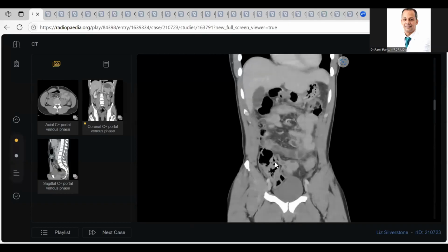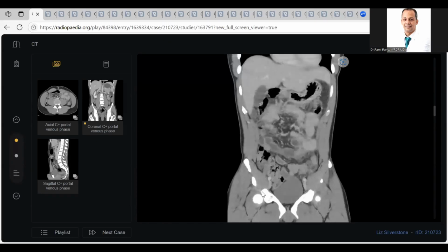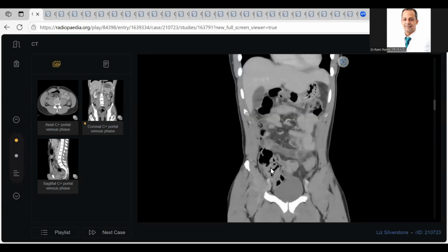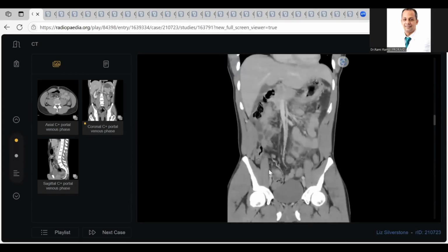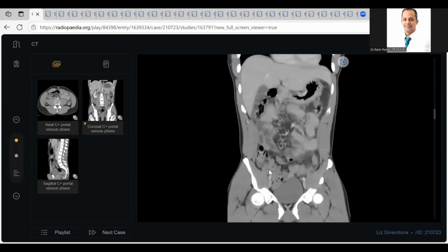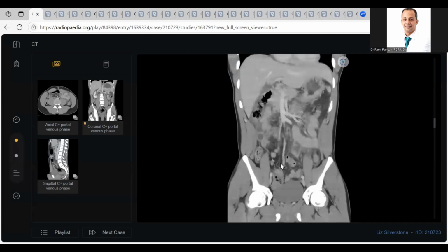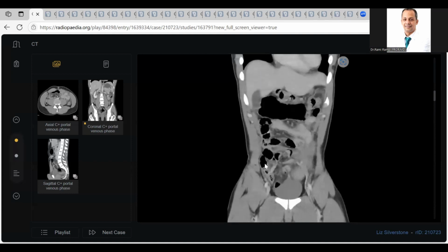Okay. Don't worry. What else do you want to exclude from the CT in case of appendicitis other than perforation? Other than perforation, I have to look for free air, any collection, phlegmon formation. We just need to know whether it is perforated or there is a phlegmon formation. Is there any acute condition? Like the appendix wall is enhancing. It is not gangrenous.